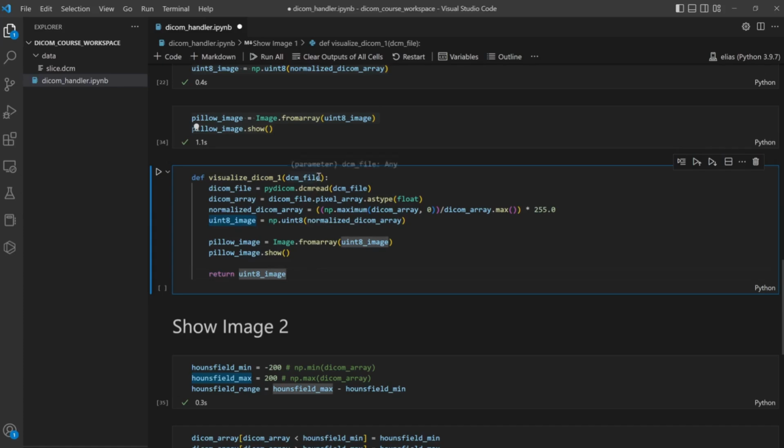So if we want to do that, we can add a parameter here. We can call it, for example, show, which is a Boolean, which takes the value true, for example. Let's take it by default false. Just something like this. By default, it is false. So if show is true, meaning we want to do the visualization.